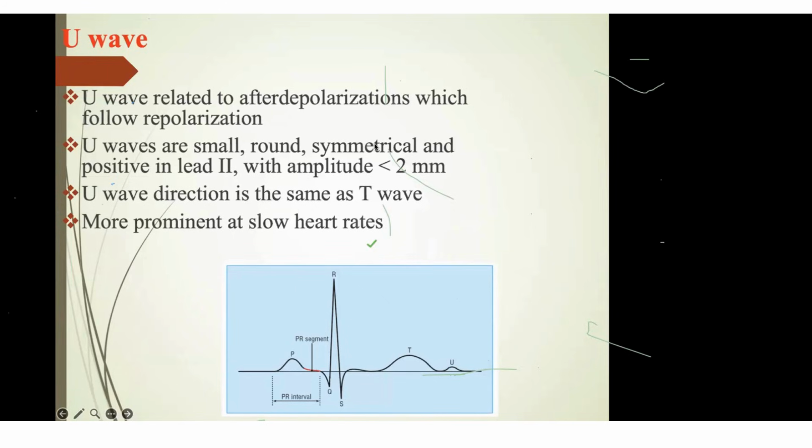The T wave height will gradually go up. The R wave height will initially go up and then come down. So it is an indicator of occlusive MI and is going to be an ST elevation MI. It's an initial period, hyperacute, and it usually goes above two-thirds.